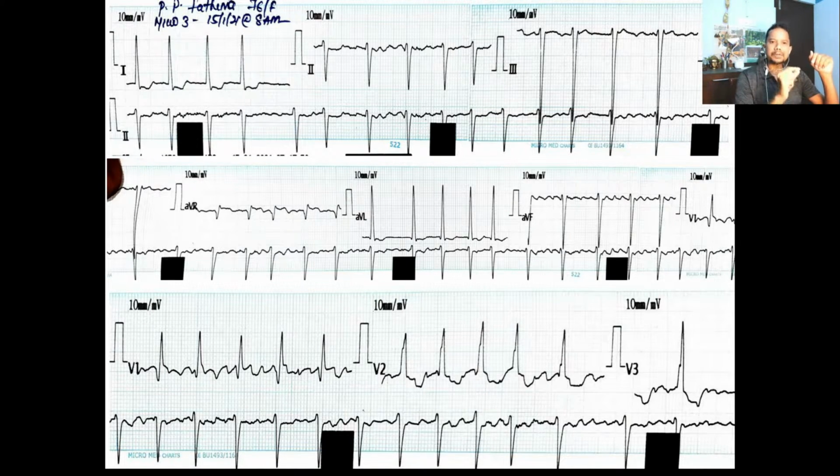So you calculate the number of R waves in those 6 seconds duration and you multiply by 10. 6 tens are 60. So 1 minute has 60 seconds. That will give you the heart rate, how many times the heart is beating in 60 seconds, because the pulse rate will be different in atrial fibrillation and the heart rate will be different. You will get a heart rate higher than the pulse rate, and that difference will be the pulse deficit, and a pulse deficit of more than 10 is usually significant.